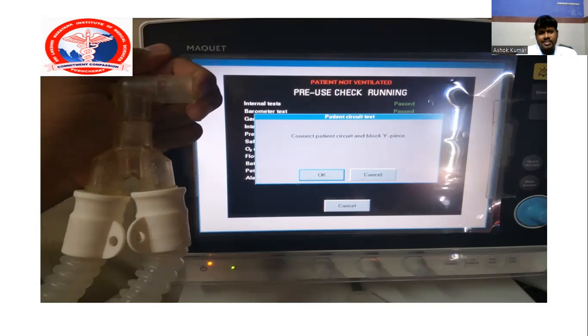The stem of the Y piece, which is connected to the L-shaped tube from the previous checkup, is the last step before the test: block the Y piece for the patient circuit test. Click OK button.